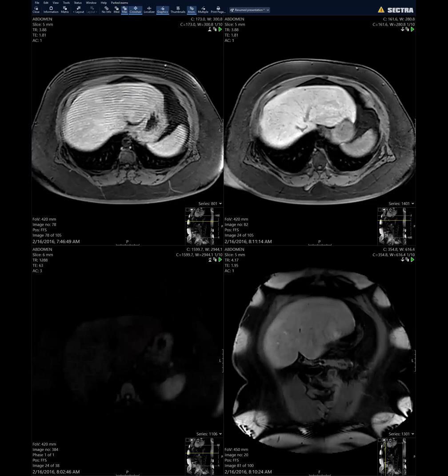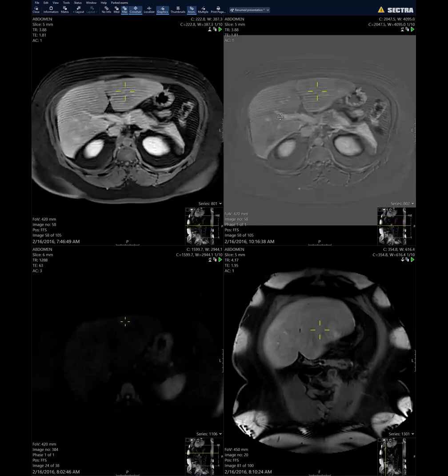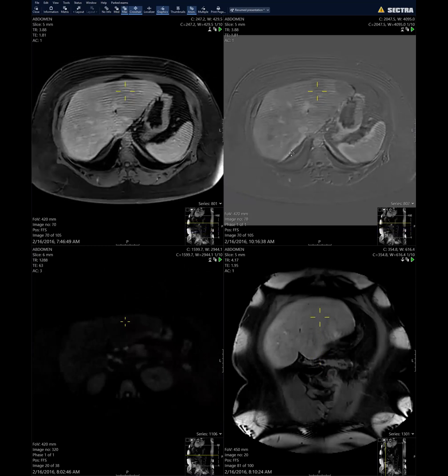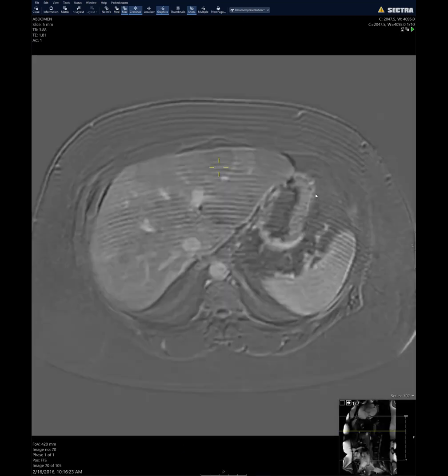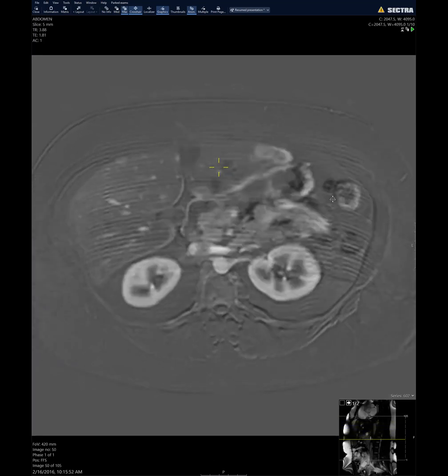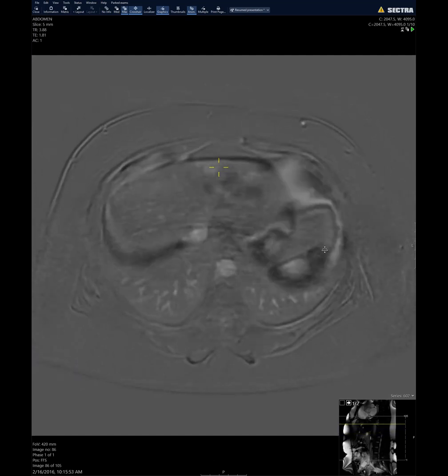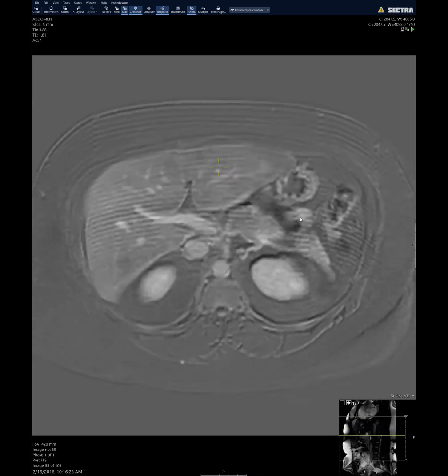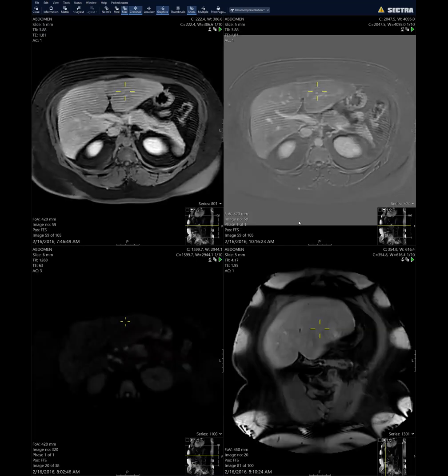Now we have a very similar looking case. So this is arterial phase, right? Subtraction. Yeah, this is right. So then there's no hypervascularity. Okay, this is arterial phase subtraction. Not a lot. In the end, it doesn't really matter. The only thing is, there also almost looks like on the portal venous phase, look at the subtraction of portal venous phase, it almost looks like there's washout, right?